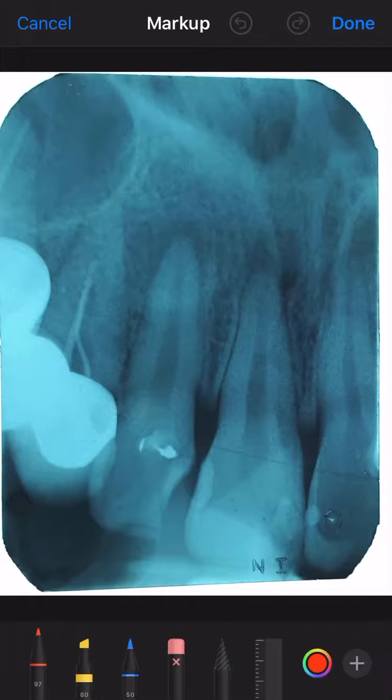Okay, this is a maxillary central incisor radiograph, and we are going to do the interpretation today. Can you all tell me which teeth you can see? Assuming that this is the first quadrant: 1-1, 1-2. Yeah, and which is the tooth adjacent to it? 1-3. Most likely 1-3, but somehow the root doesn't look very long. So we're not very sure. Probably a canine or maybe a first premolar because we can't see the root so clearly.